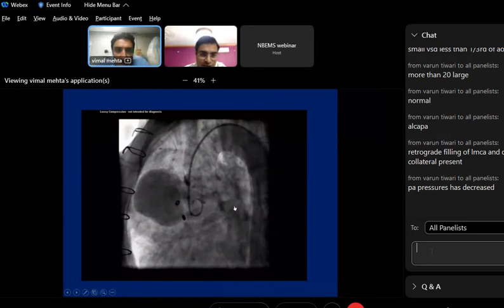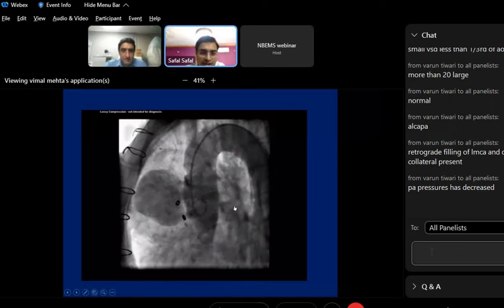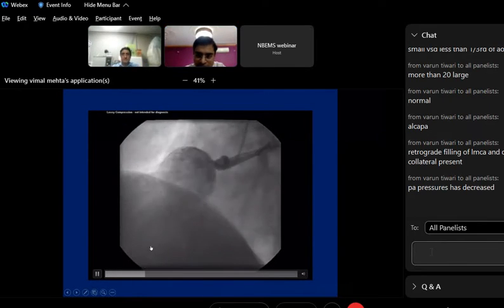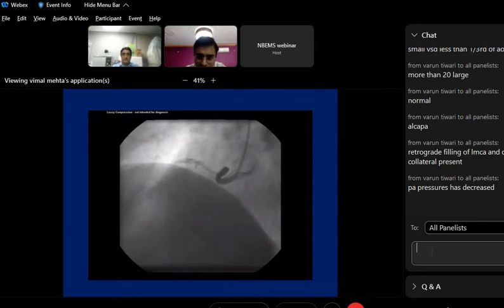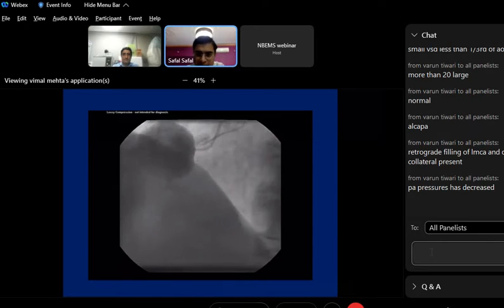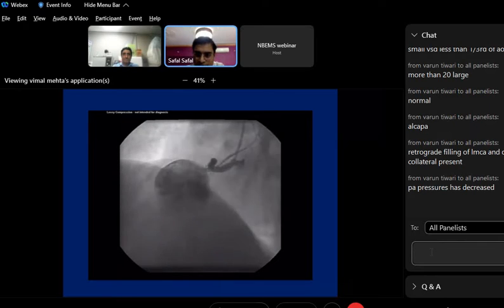What are the possible etiologies that you end up with this kind of aneurysm? Just a few differentials. Well, okay, one such huge aneurysm, Kawasaki could be a possibility, more likely of smaller and multiple aneurysms. Atherosclerosis per se only has this kind of aneurysm, unlikely.